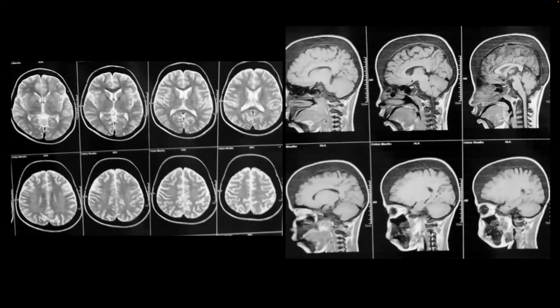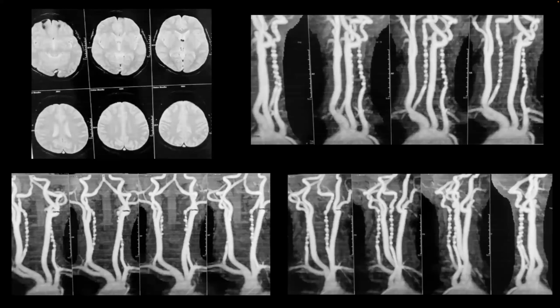I don't have the images across the transverse foramen to check if there's narrowing or not. But I haven't come across that case report. The case which was mentioned was from Delhi, from Lady Hardinge. They had a similar case with compression at the foramen transversarium, and it was symmetric across the vertebral arteries.